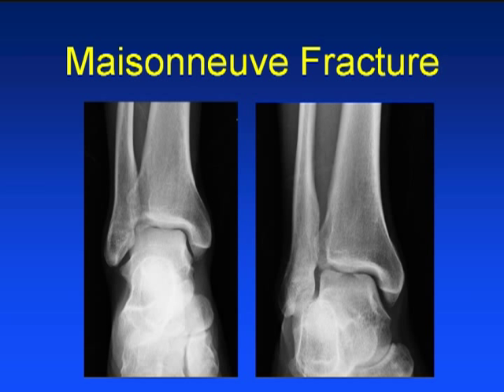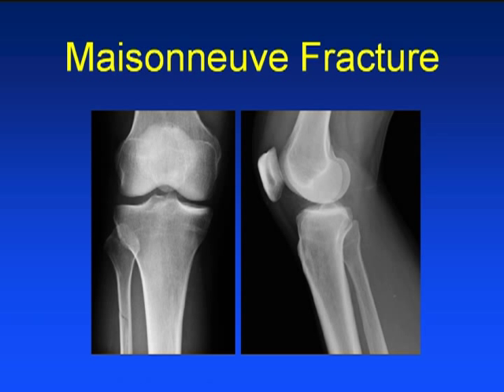These are notoriously hard if you go just by the clear space. What I end up doing in real life is the ER docs are pretty good about it: if the patient won't bear weight and we don't see anything down low, they tend to reach up and feel at the fibula, and if it's tender proximally and laterally, they'll get the extra image. And here you can see a very subtle proximal fibular fracture.